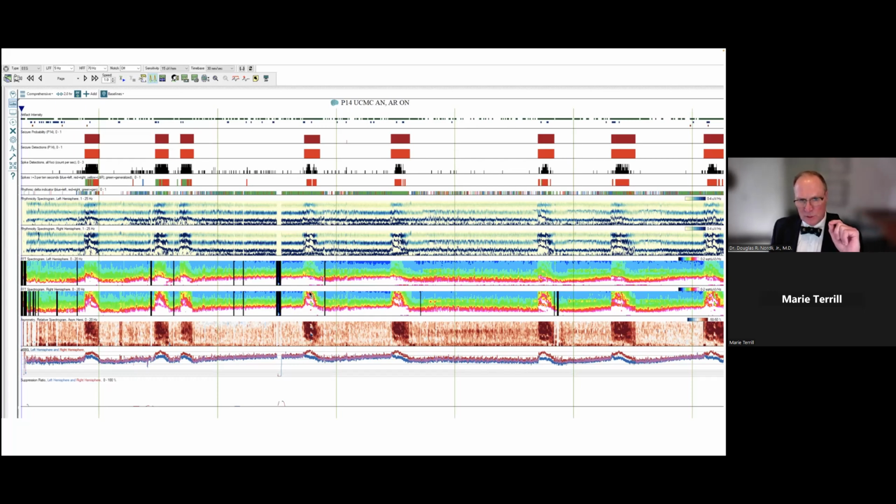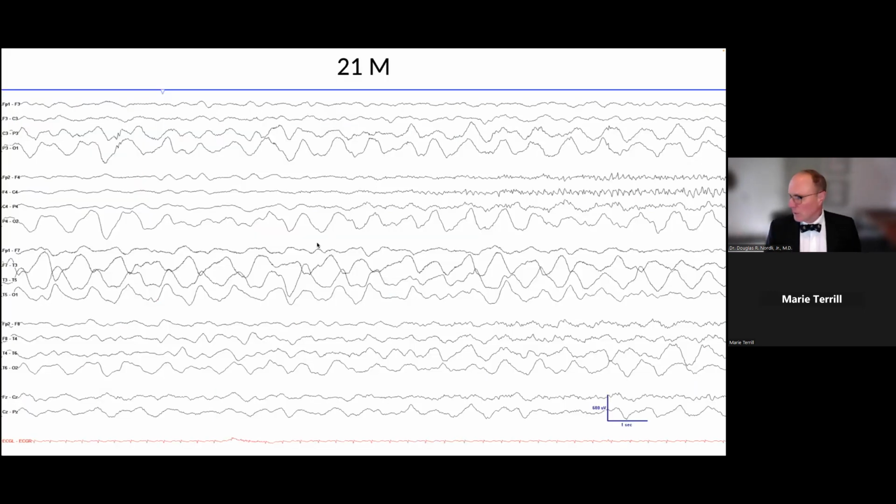You see an increase in power in frequencies, particularly in the mid to high range here. And beautifully shown on the rhythmicity spectrogram is the difference in that. And you can see the increase in power in rhythmic frequency elements over here in the rhythmicity spectrogram. So super, right? Focal seizures, infants and above, are going to look very much like adult patterns, and Persyst does a beautiful job of detecting those. You don't believe it? Let me show you another example.